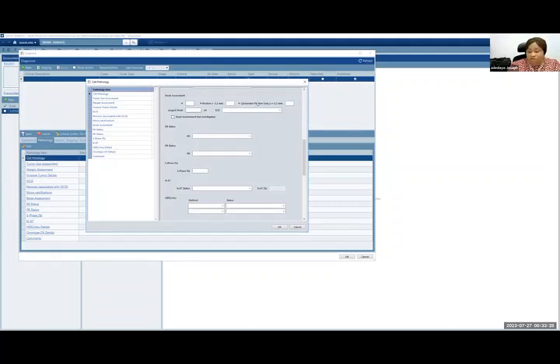And there's no way to be sure when that data is pulled out. There's no way to be sure that this patient didn't have nodes or had nodes or whatever. So we have to always indicate, even when it is negative, that negative indication has to be specified. For receptor status, again, it is the same options.